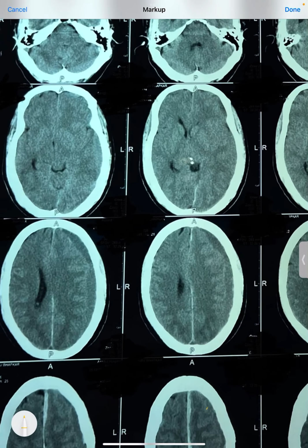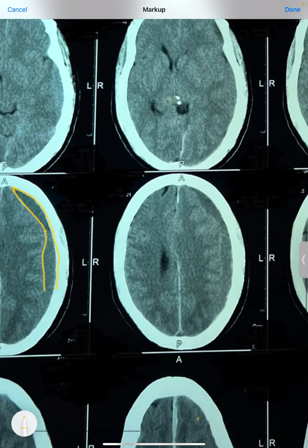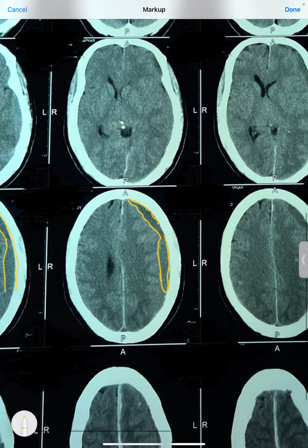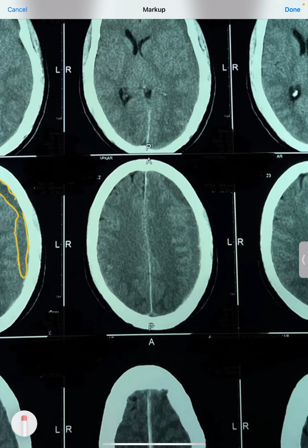So what we can crystal clear make out is there is one hypodense lesion or structure which can be very clearly made out in this area. The same thing is with here as well. There is a hypodense lesion in this area. The markings are not crystal clear, so it is more of a concavo-convex structure. Means this is more of a, like this.